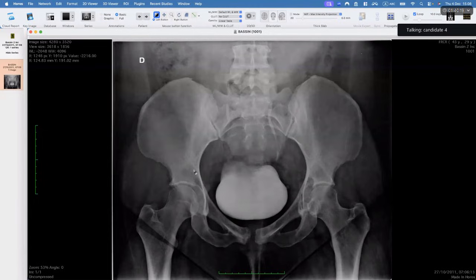Coming back to the findings, these are multifocal, small-sized lytic lesions involving the said regions. If the patient is of older age, my top differential with these deposits would be metastasis if there is a known malignancy, since these are lytic.